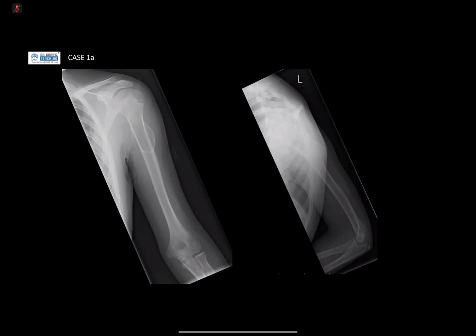In this view, I'm suggesting this is projecting from the bone. It has a narrow zone of transition. I need another orthogonal view to better visualize the bone.